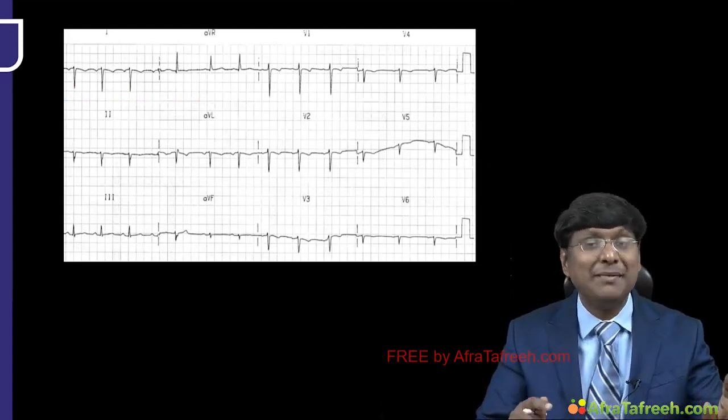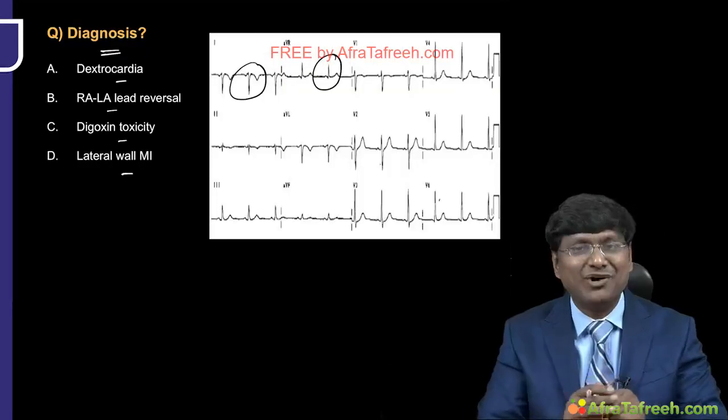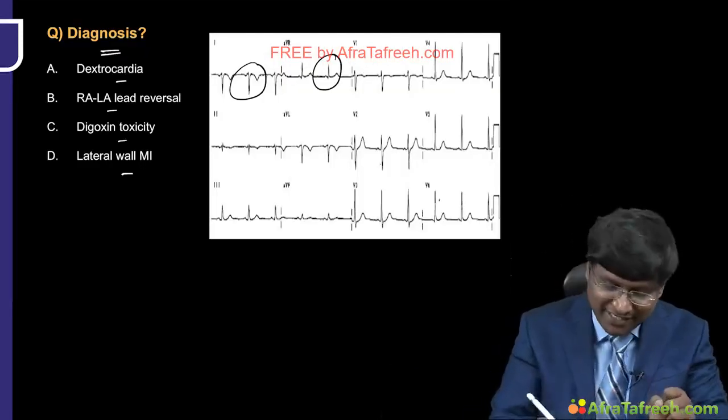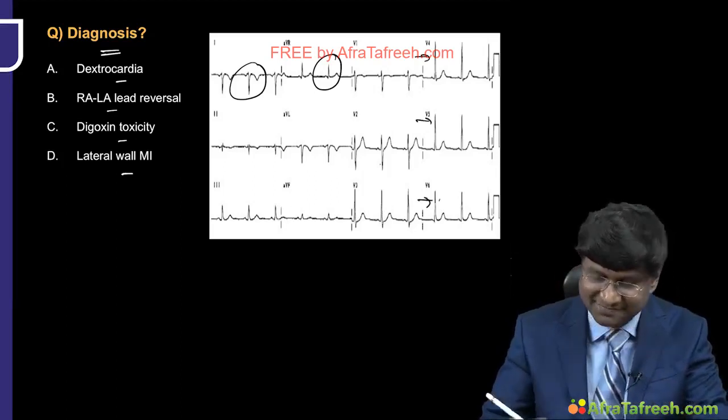in dextrocardia. But in the following ECG we are discussing now, if you take the R wave progression, you have the normal R wave progression.